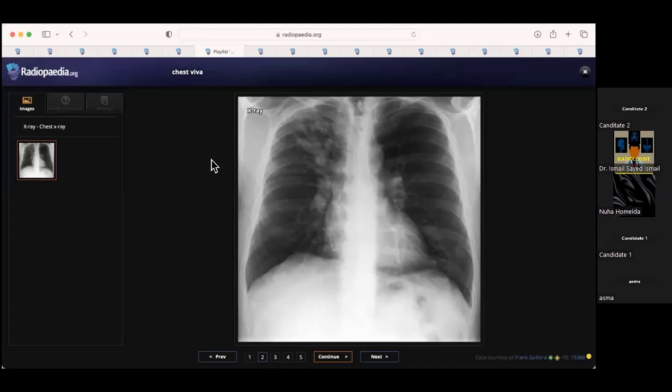In a young patient with a tubular opacity confined to the upper lung zone, I will be thinking, if the patient has a history of asthma, of allergic bronchopulmonary aspergillosis with finger and glove appearance. I will correlate this with the previous images, and see if the patient is known to have any history of asthma.